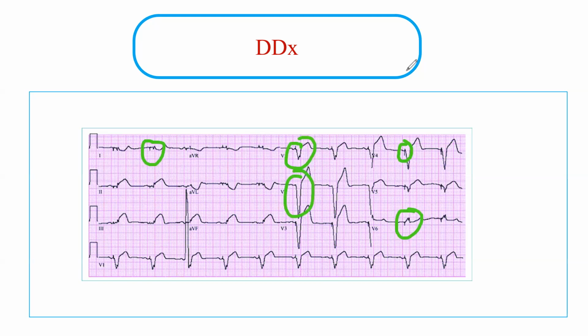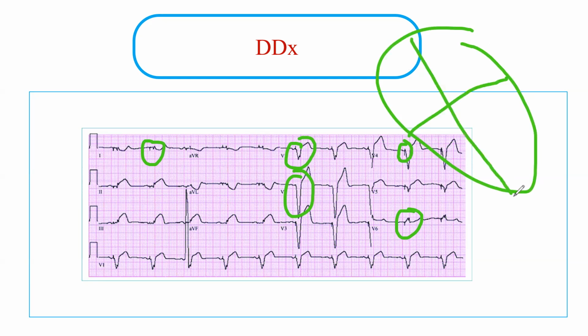And actually, if the patient is having a right ventricular pacemaker, again, this is the heart, and let's say the patient is having a pacemaker here in the right ventricle, it will give you a similar morphology on EKG, because when the electricity is generated from the right ventricle, it will travel to the left ventricle and will have the same criteria. So the only difference between right ventricular paced rhythm and left bundle branch block is the pacing spikes. If you see the pacing spikes, meaning that this is not left bundle branch block, but rather it is a right ventricular paced rhythm.